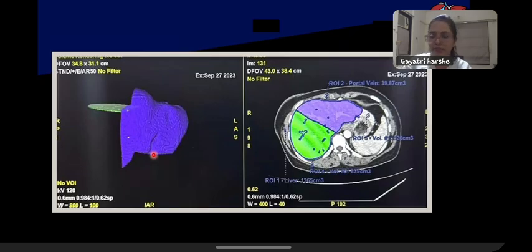If we are doing the automatic method, we just have to feed these sections or the venous phase into the software, and that will give you the exact total volume, and if you feed the right lobe with MHV or without MHV, it will give you the volume directly. So these are AI generated methods. The softwares are slightly costly, so we go with the manual method.